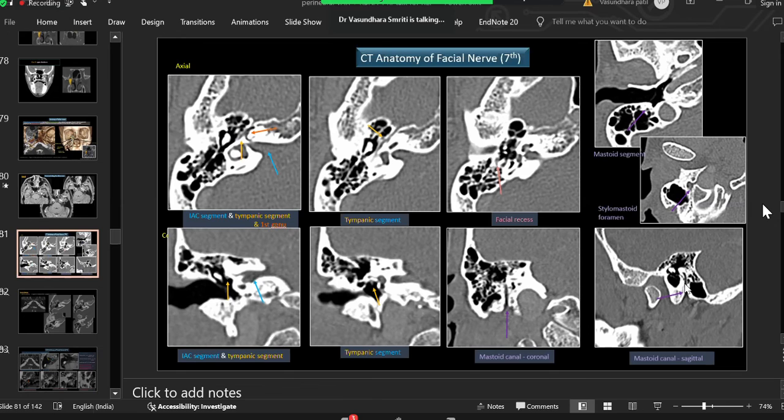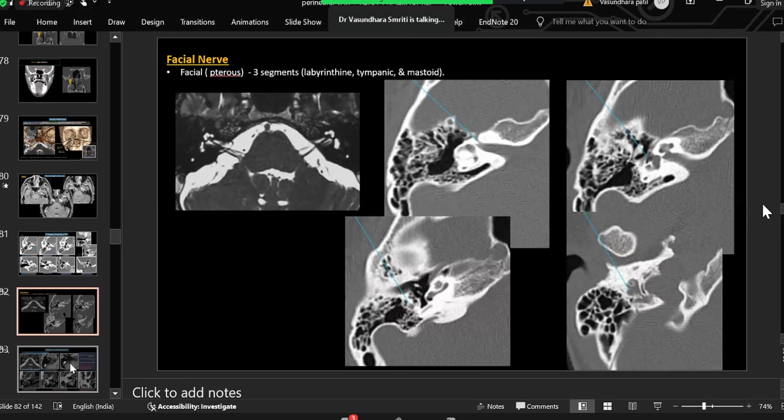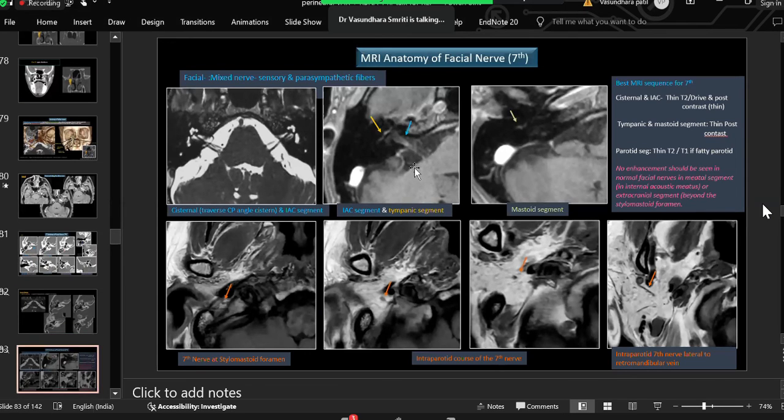It is very interesting to see this facial nerve on an MR. If you do your MR and take post-contrast thin images, you can see this nerve in all patients. They are not non-enhancing, but you can see the nerve like this traveling behind and then the mastoid segment. So for a thin T2 for the brain, and thin post-contrast images for the brain, start looking at your facial nerve. You will see the entire facial nerve till it comes out through the stylomastoid foramen. Okay.